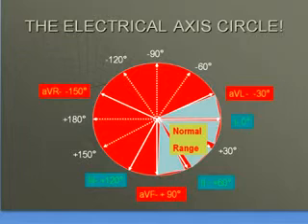So, you require the 6 limb leads to identify the electrical axis of the individual. The normal axis ranges from minus 30, which is formed by the AVL lead, to plus 90 degrees, which is formed by the AVF. So this is in general the normal axis, and AVR and lead 3 form the abnormal axis and right axis deviations.